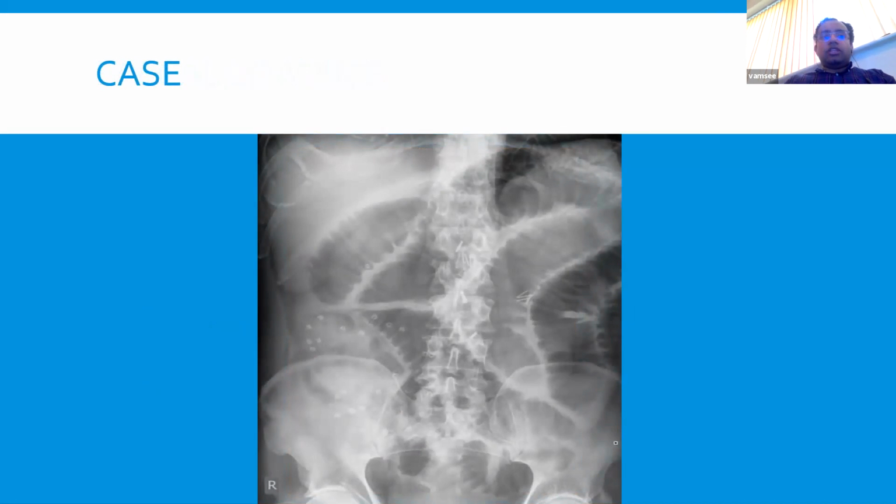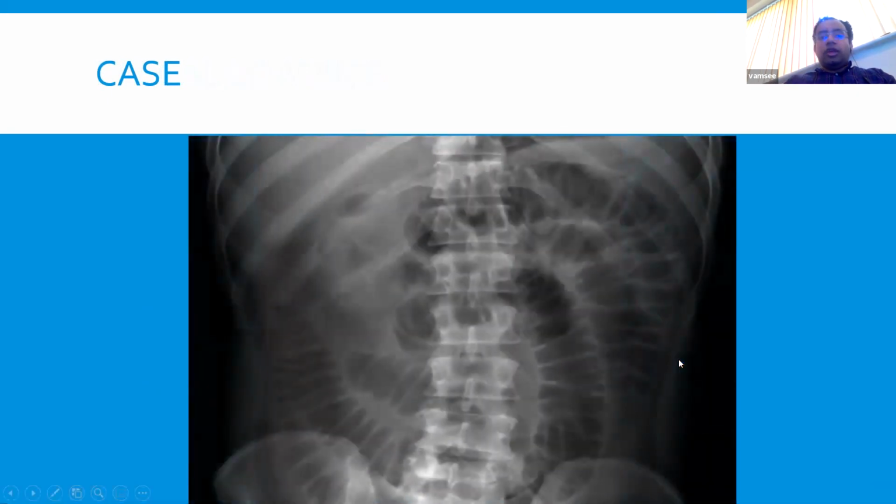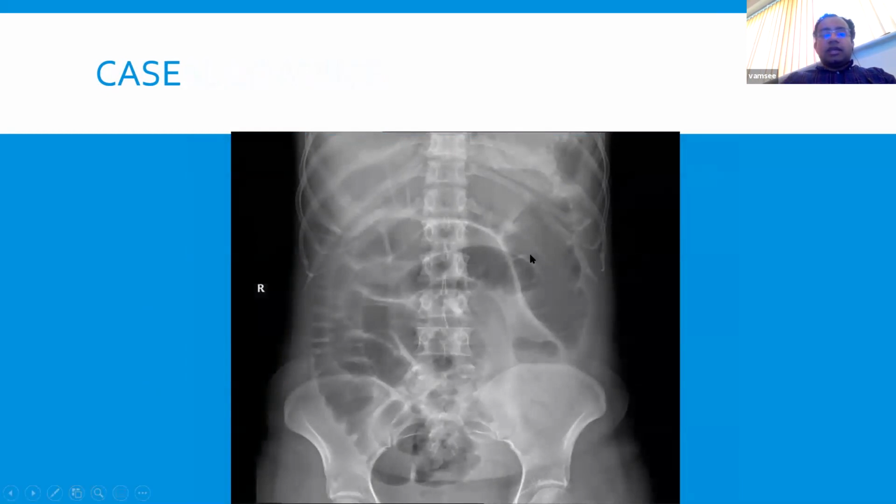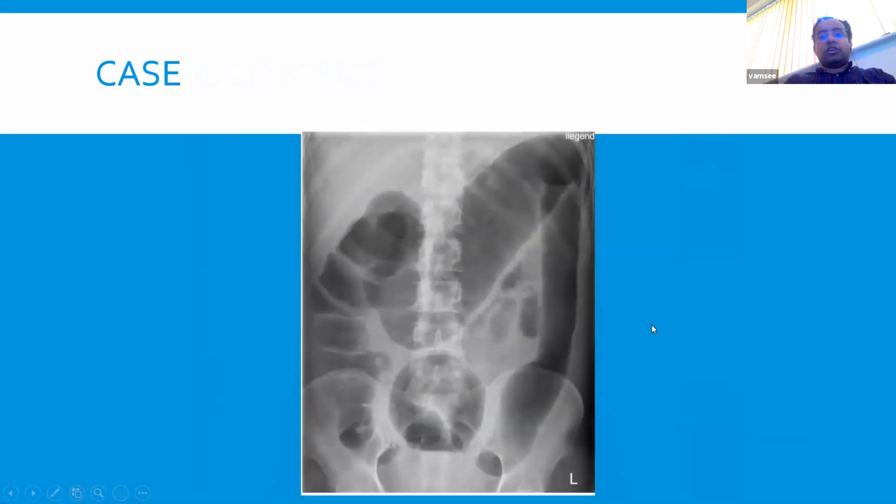Fine, this would be small bowel, as you can differentiate it. It's dilated and it's valvulae conniventes prominently, going all the way through. Again, this is another example of small bowel. This is a large bowel. It's much larger. You've got incomplete bands going all the way through, so that gives a very large bowel.